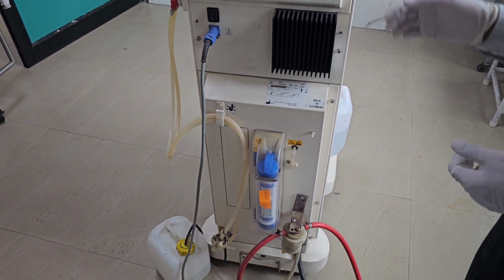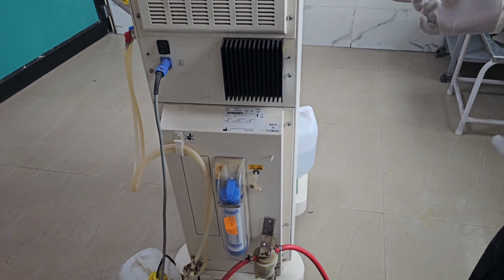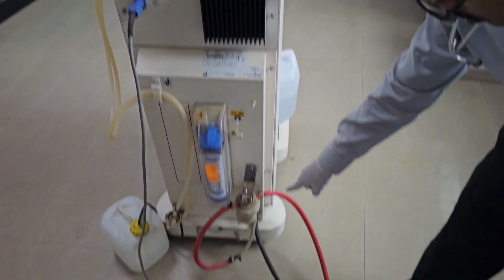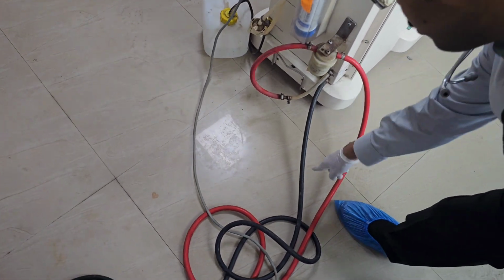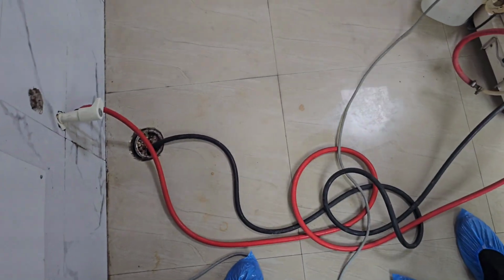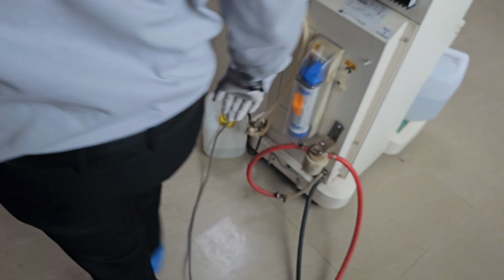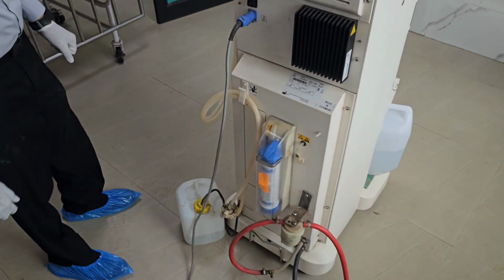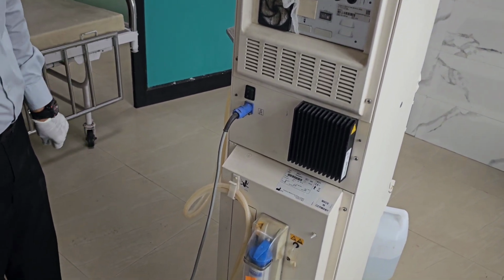Whenever dialysis occurs, during dialysis we might be told to remove water from the patient. So what will happen to the water which was removed? This will come out through the black color tube which is over here. This is the drainage tube which goes to the drainage. So this completes the part of the hemodialysis machine. On the back side, here you have a power button also. You can switch it off, switch it on.